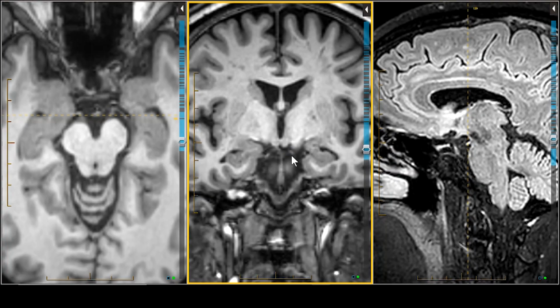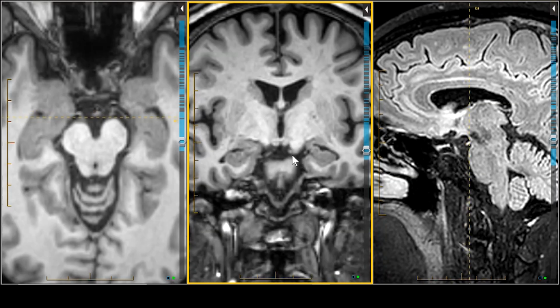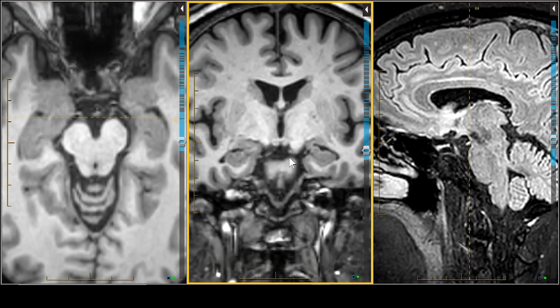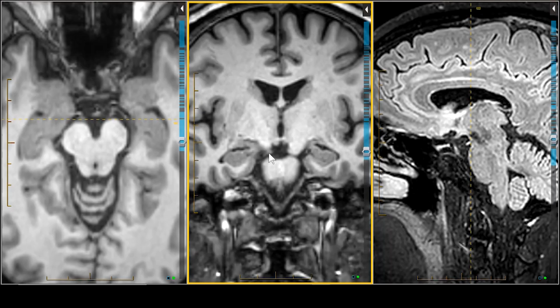Now, in the coronal projection, all you've got to do is find and cross-reference the third nerve with the third nerve in the axial projection. So you have to be able to locate it in the axial projection, which is easier. Then I like to follow the third nerve back towards the midbrain. Another way to locate the third nerve, if you're spot localizing it in the coronal projection, is to go down and to the side of the mammillary body. So there are the two mammillary bodies. Down and to the side, there's your third nerve on the left. There is your third nerve on the right.